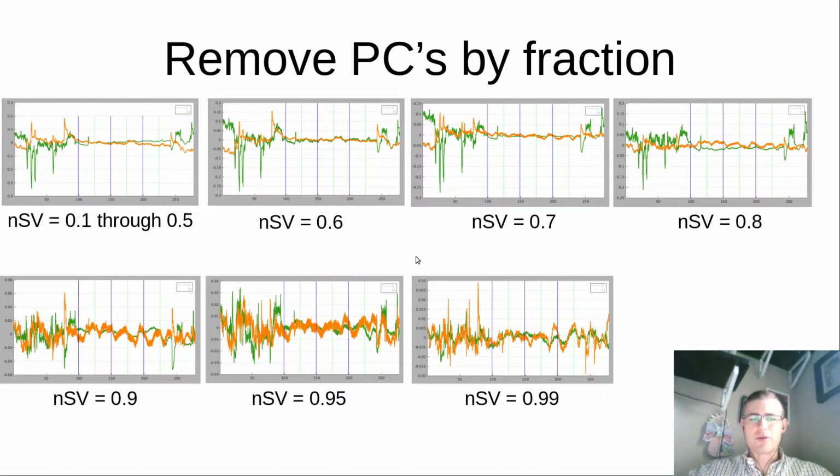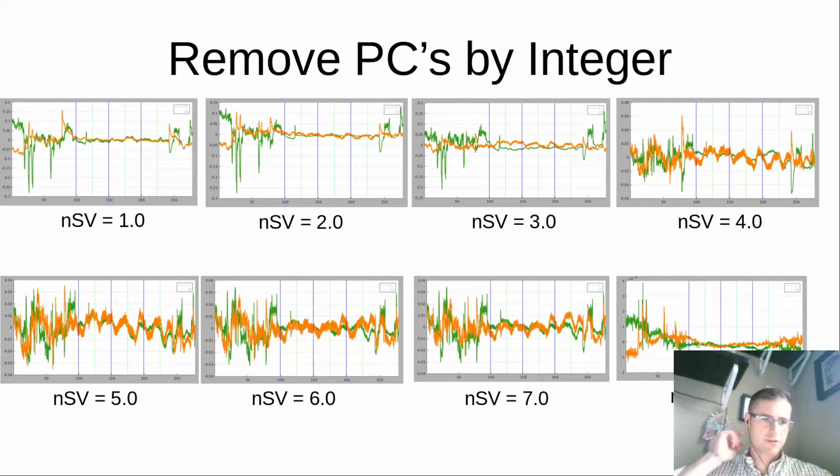Once you remove too much, it's not really giving you anything useful at that point. You've probably removed any significance from anything in the data. So you want to be not too aggressive in this. And if you find yourself being too aggressive, perhaps your data is not the most high quality.